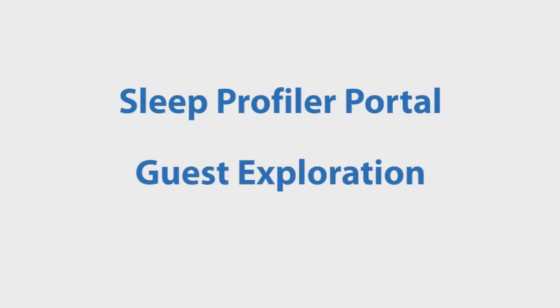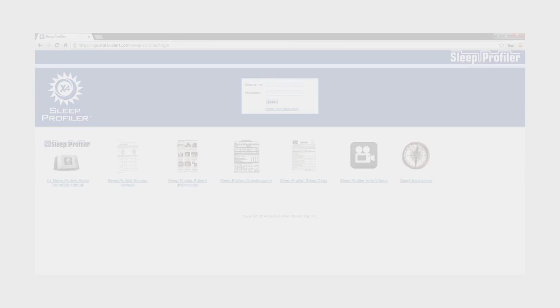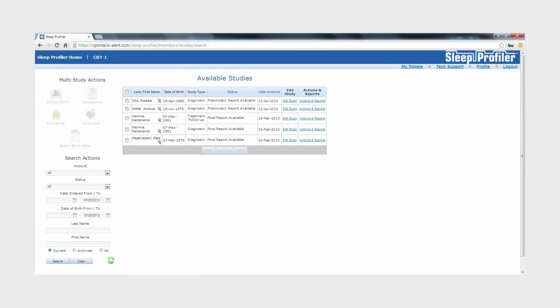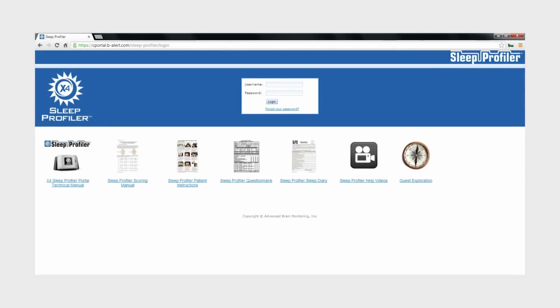Sleep Profiler Portal Guest Exploration. This video highlights options for exploring the Sleep Profiler portal using a guest account with actual sleep study files and reports. Our intention is for you to watch the video and then repeat with hands-on interactions using guest exploration.